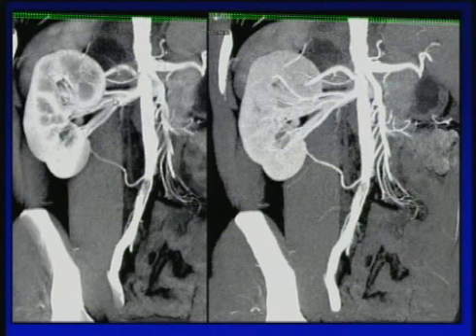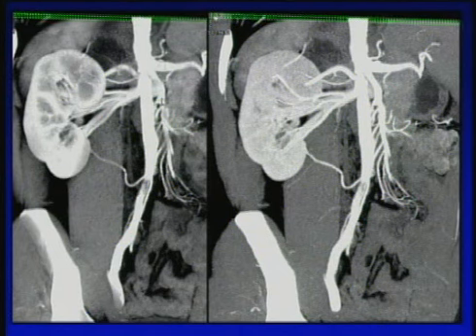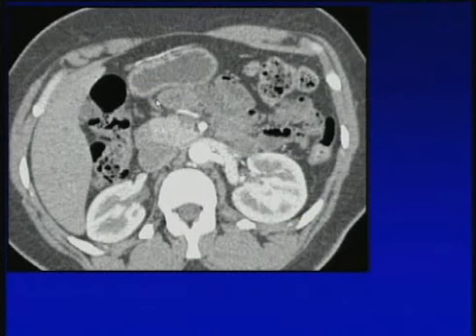We also recognize that prehilar branching is incredibly difficult to ascertain on axial images. You can overcall or undercall. Accuracy rates are in the 50% range, while on 3D imaging, it's basically 100% for doing that. You also recognize that even if you are very careful, there are times you'll miss small renal arteries.